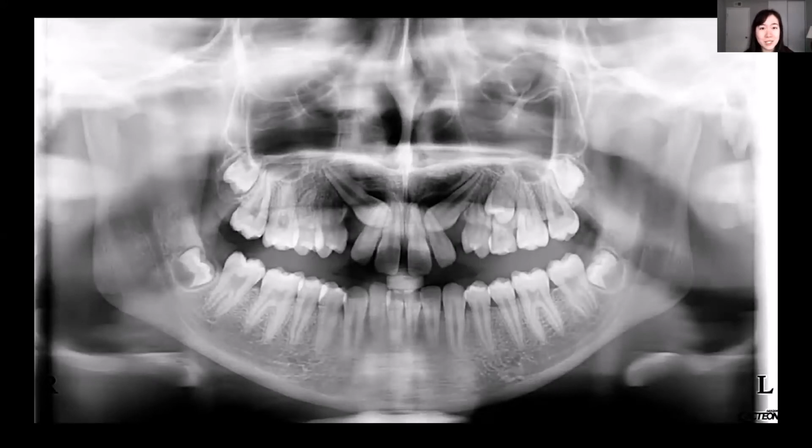There are 2 teeth in this patient that are going in the wrong direction. Instead of coming downwards and into the mouth, they're going inwards, towards the center and toward other adult teeth. This can be a big issue. These 2 teeth are known as the canines, and here they are impacted canines because they are blocked out and unable to erupt.